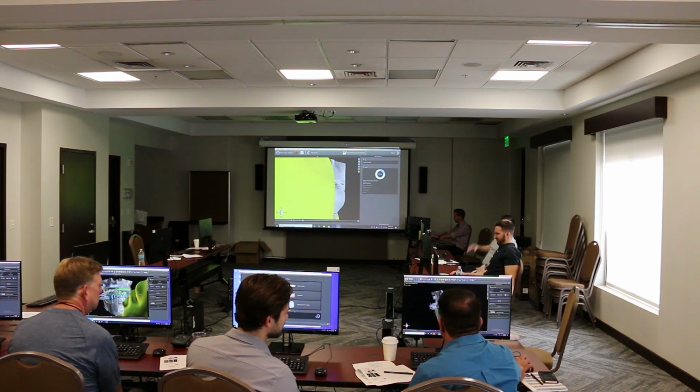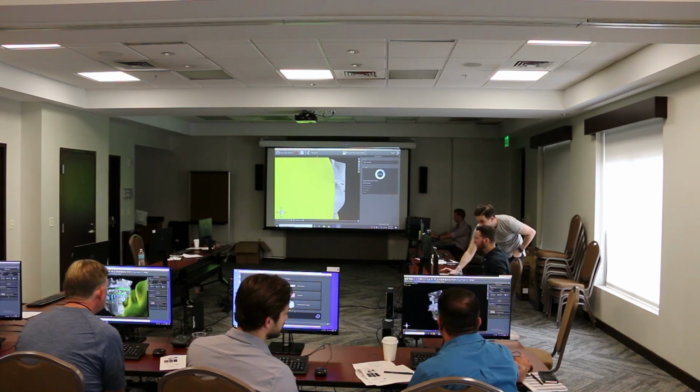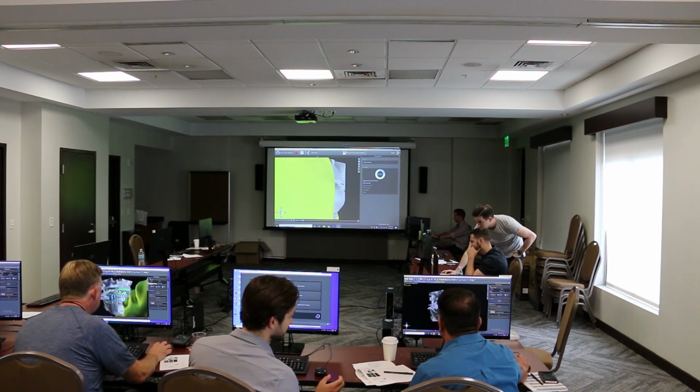I mean, you have all this excess weird stuff here. So that's part of the CBCT. Okay. You're going to run into that too. That's why we included that in the course, because you're not always going to have professional CBCTs that have no scatter, especially with patients with restorations, PFM, everything like that.